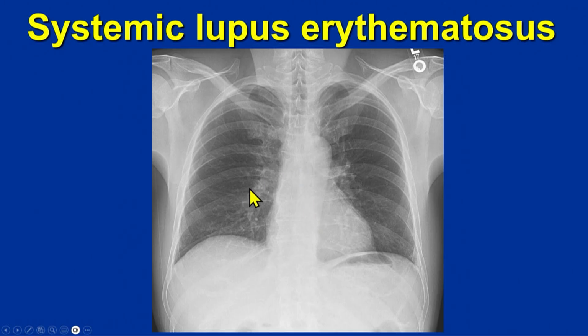I remember this case. So this patient came in for a PA and lateral radiograph. I'm just showing the PA radiograph here. And so I called up my technologist. I knew the technologist who took this image. She is wonderful, right? She's got slight OCD, which for a technologist is a good thing. And so, she sent this to me, and I said, why didn't you have the patient take a good breath? And she said, this is actually the second image. We really tried to get the patient to take a good breath. So because of her OCD, she brought me into the room, right? And she said, can you help the patient maybe take a better breath with some coaching? And so we tried, but this is the best we can get.